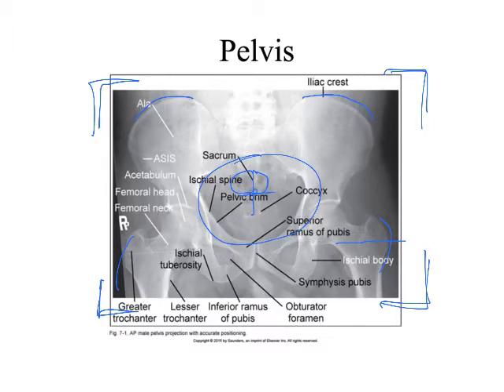So I need to know a little bit about this anatomy in order to tell you that all the anatomy is included on the image, right? So ischial tuberosities, greater and lesser trochanters, and then iliac crest. Are those things demonstrated on the image? Yes. Is it coned appropriately? Yes. Then it must be appropriately centered, right?